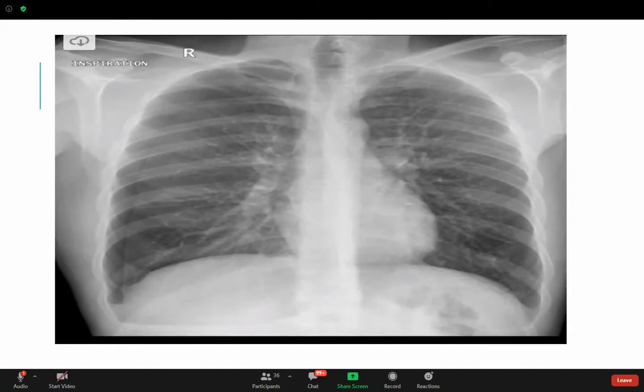Okay? Okay, guys. Focus with me. Let me just put this in the chat. I will lower it a little bit. And I'd like you to focus with me on this X-ray. This is an important X-ray, it can save a life in practice. You should recognize it as soon as possible. You guys see this X-ray. You see the left lung.